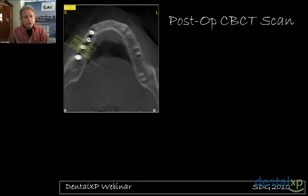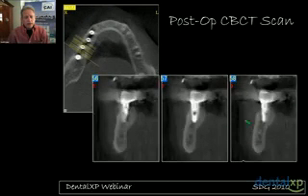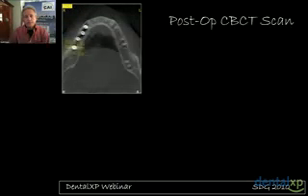Now here's the third implant. Same result. Third implant, in this case, we're avoiding again the lingual concavity, and we have nice amounts of bone around the implant. The implant is pretty much smack dab in the middle of the tooth that we try to replace. Restoratively driven implant dentistry.